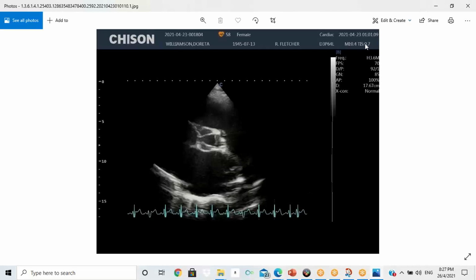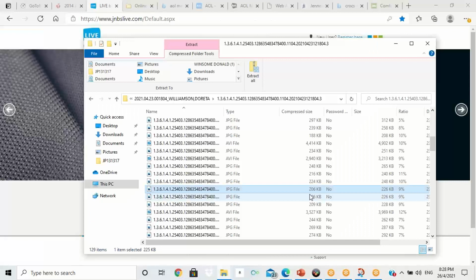Understanding short axis at the level of the aortic valve. You can see the aortic valve open. It opens in a triangular configuration. Okay, this is one cusp. It's another cusp. The next cusp is right there. With that, the atrial septum, that's the non-coronary cusp. You have to know your structures.